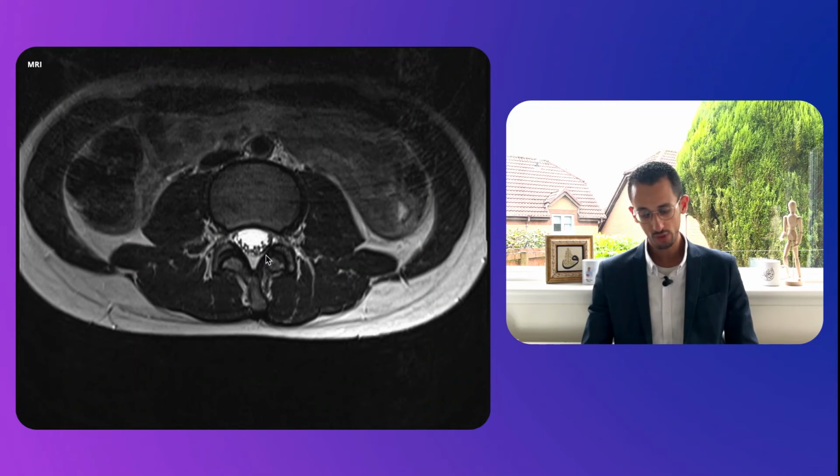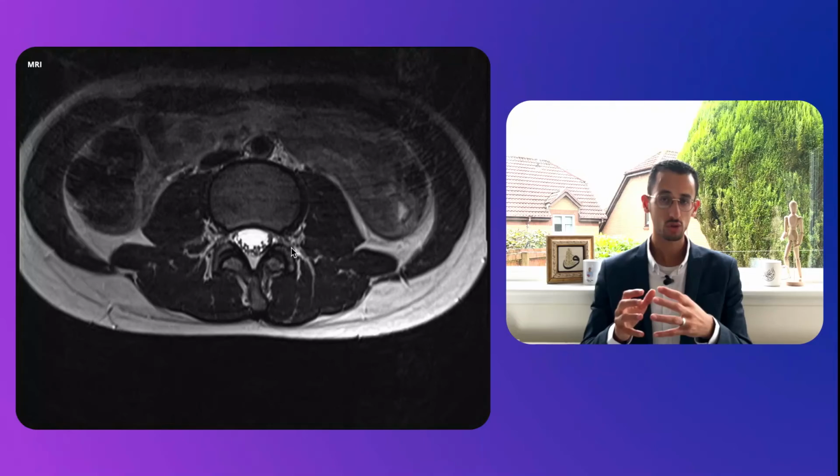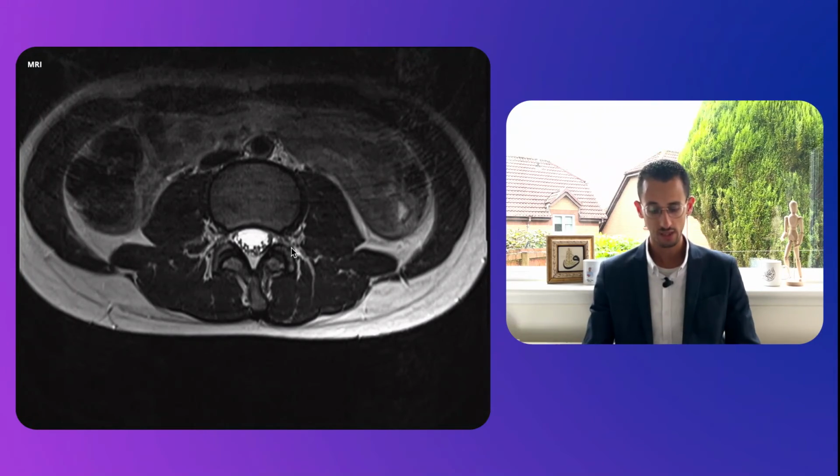And also what's important is to look lateral. Laterally means that's the center here, and more lateral is basically the lateral recess. So you need to identify, is there pressure on the nerve as it's coming out of the spinal canal towards the foramen that's causing a lateral recess stenosis, or pressure on the nerve root on the lateral aspect.